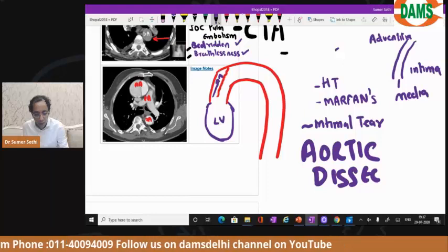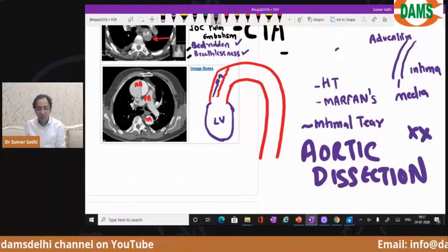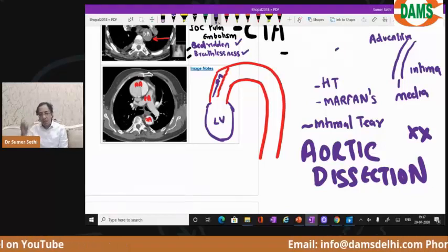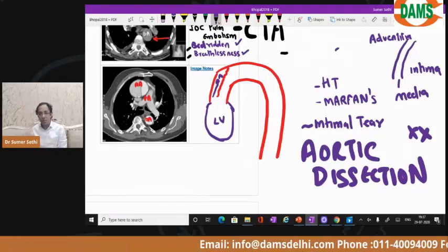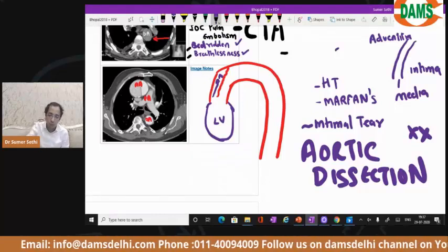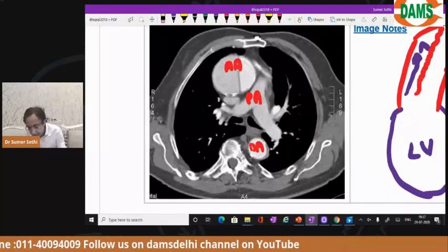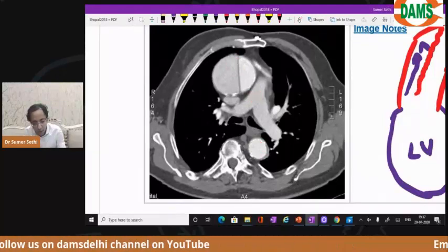Every year you will have a question on aortic dissection, whatever may be the exam. Whatever exam you may give, even if you go to America and give the exam, you will find the same things that I'm telling you they will ask, because they are important clinically. Now I want you to see the image again. I'm sure you will be able to pick it up.